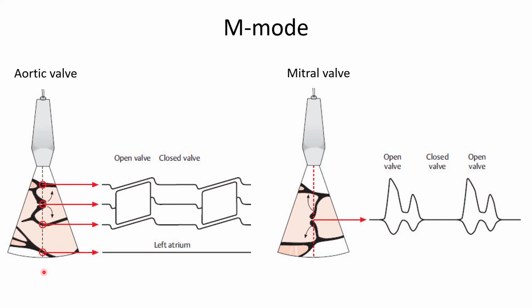But before we can discuss any quantitative measure of ejection fraction, you have to understand M-mode. M-mode is an imaging modality on the ultrasound machine that takes one crystal and graphs it over time. It's also known as motion mode. So you'll notice that the x-axis is time here, and the y-axis is depth. And so this aortic valve would be graphed similar to this, with opening in systole and closure in diastole. Same with the mitral valve. It'll be open in diastole here and closed in systole. This has a very high frame rate, which is useful for fast-moving objects.